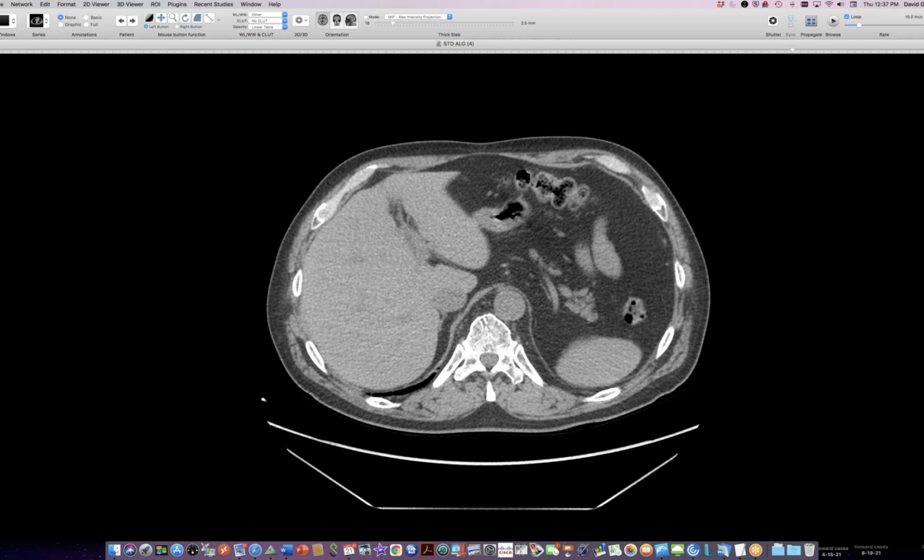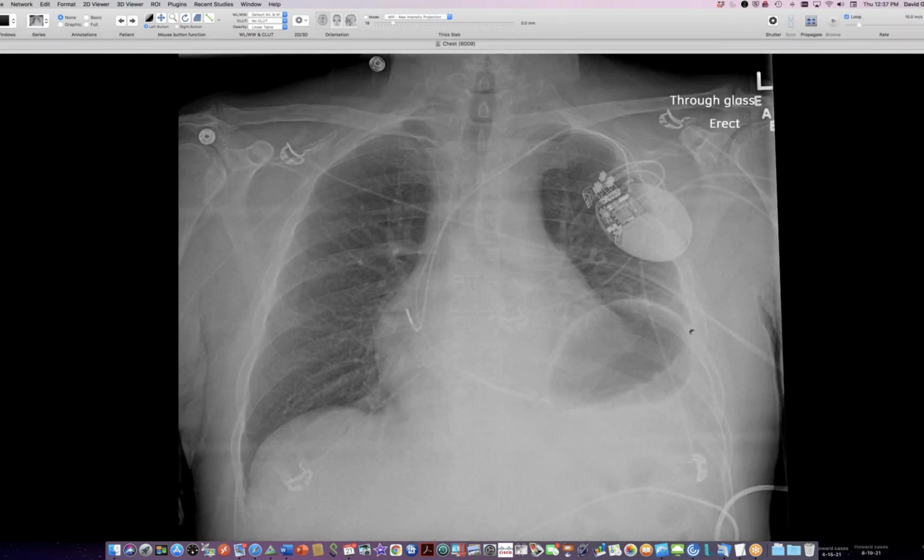radiographs are here. So he was back last month, and you can see that, especially with his lying in bed like this, this is last month, a year after we had that earlier imaging. He's got even more elevation when he's in bed. So putting a person supine, particularly if they have obesity in their abdomen, will exaggerate the elevation from a weak or paralyzed hemidiaphragm. So putting the person supine is another stress test, not just sniffing, for showing hemidiaphragm elevation. So he's still got it, it hasn't gone away. So COVID is a cause of diaphragm dysfunction by affecting the phrenic nerve.